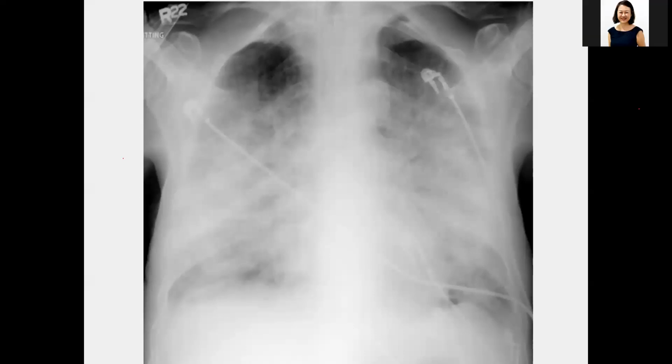Is it bat wings? Yes. So Dr. Betty can answer most of the X-rays. This bat wing, this bilateral consolidation already obscuring the heart, maybe some cardiomegaly, and also blunting of the costophrenic angle with some pleural effusion, pulmonary edema. All right.